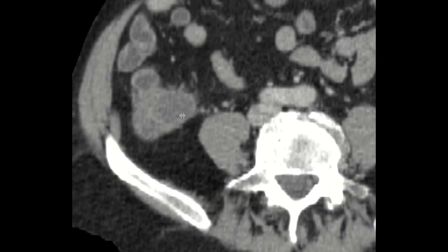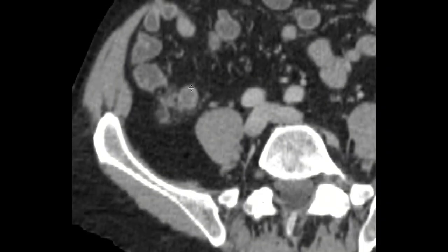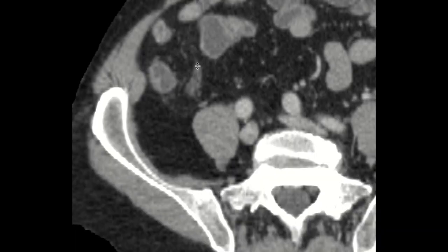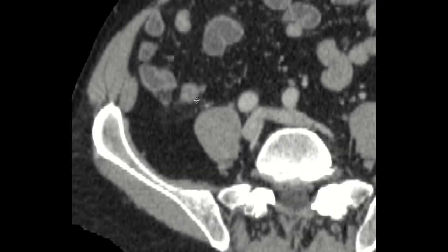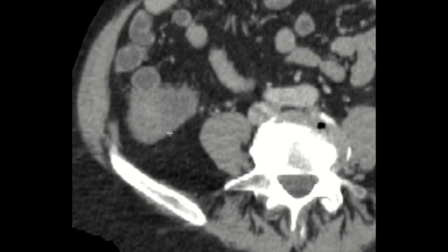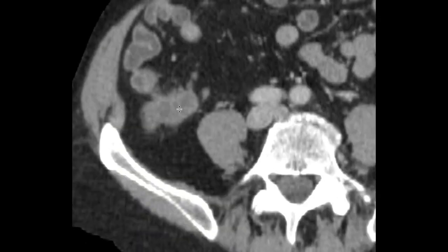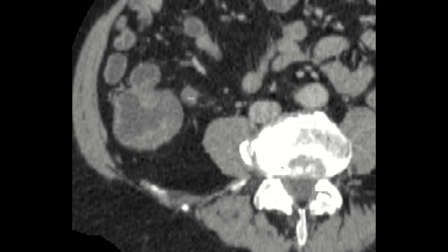When you have appendicitis, you usually have something blocking the base of the appendix, and then the distal parts become dilated, and they dilate all the way out. In this particular portion here, we're not seeing dilation in the most distal portion of the appendix, so that wouldn't make sense for that. This ends up being an irregular soft tissue mass, and so this is a patient with appendiceal adenocarcinoma.